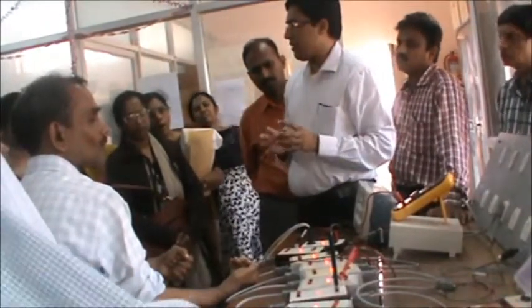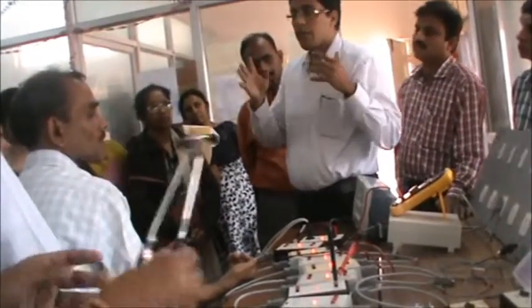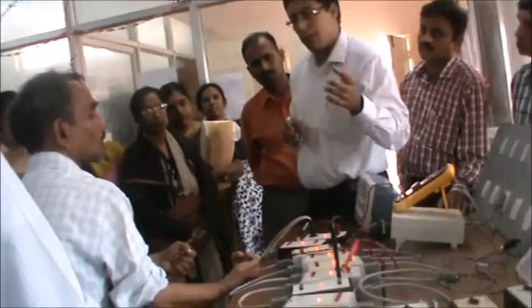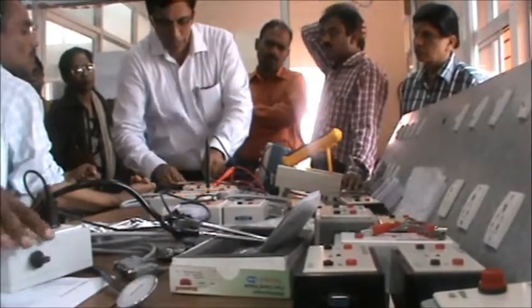Normally heart rate variability is done over a period of time. It is not done for 10 seconds or 20 seconds. Normally the international standard is over 3 minutes or 5 minutes. That is what they take and do the HRV analysis. So we have various amplifier models. So let us look into that.